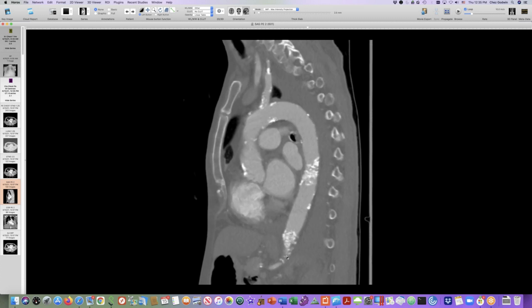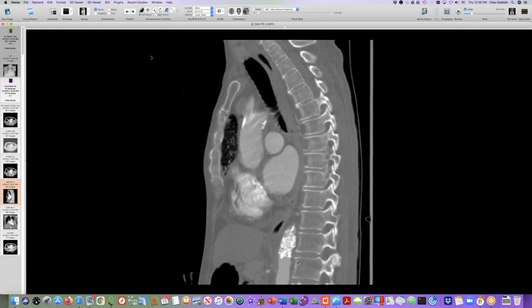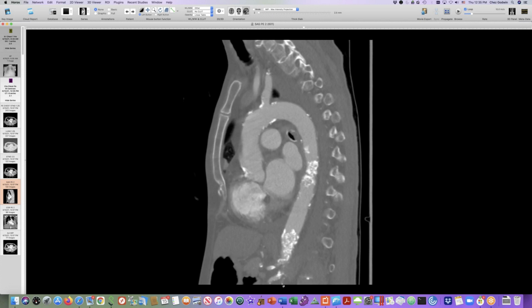And then one of our radiologists looked at this and said, well, first of all, what do you guys think? Have you ever seen internal aortic calcification with this pattern that is not occlusive? I mean, it's not an occlusive tumor. So let me show you what the sagittal looks like, and then I'll ask for your suggestion, because nobody knows what this is.